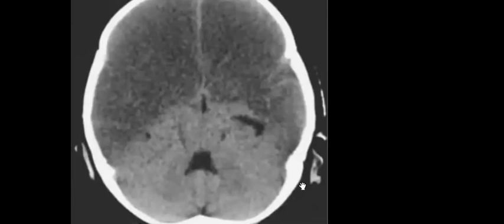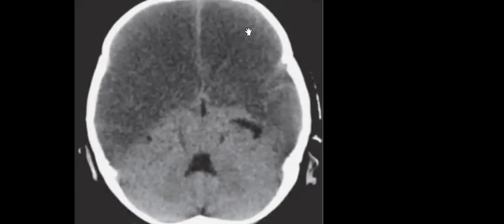What do you think about this? Yes. So diffuse cerebral edema, effacement of the sulci and the gyri, the gray-white matter interface almost lost, and there is loss of the normal junction between the white and the gray matter. Just spared here, the cerebellum and the brainstem. So this is what is called the reversal sign, or white cerebellum sign.